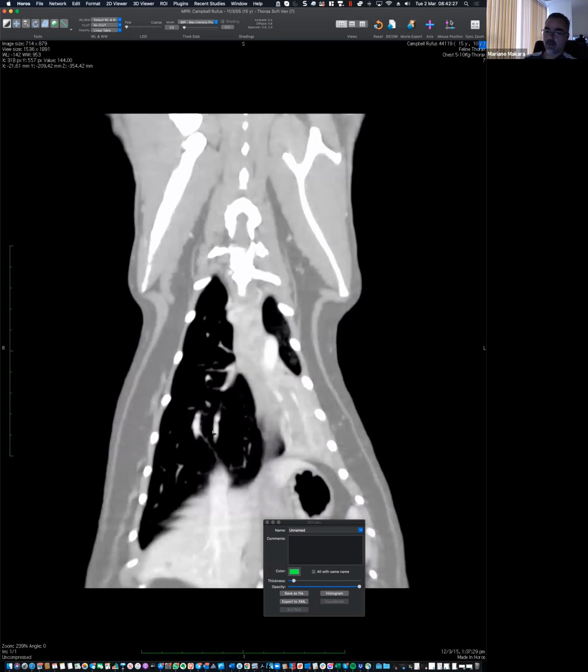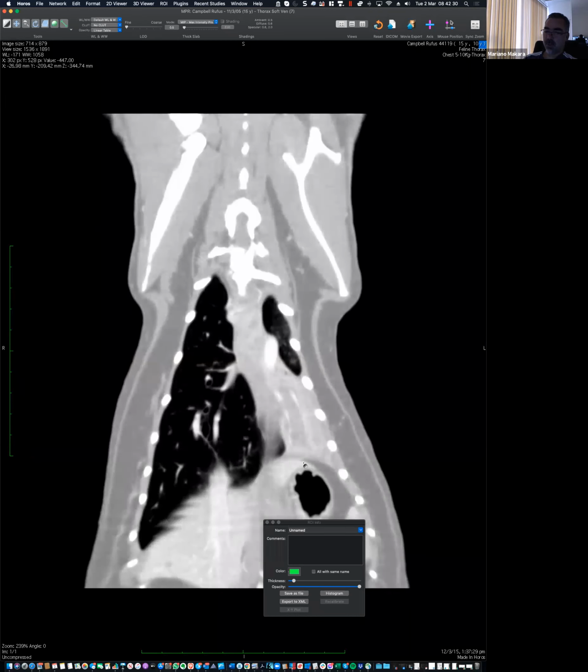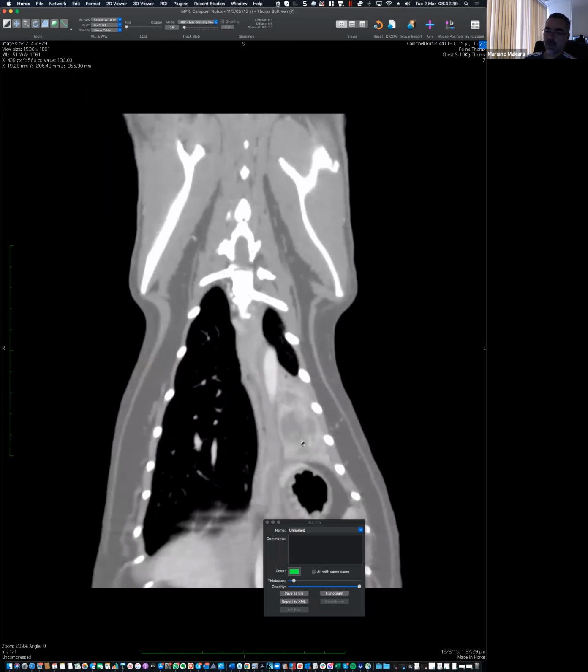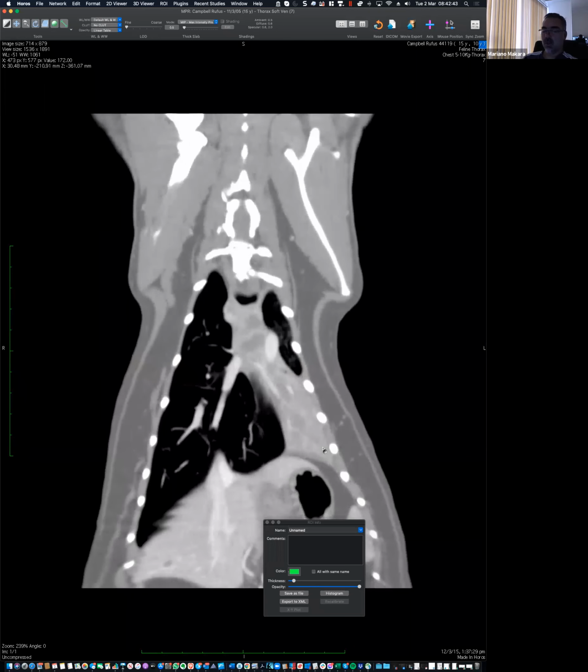That's a normal airway, normal bronchi. In the affected side, the lung is smaller, there is soft tissue opacity, and there is soft tissue material within the airway. Okay, and this is probably part of the mass. So the mass really grows here, it walks through the airway, and then results in a mass there. Makes sense? So it's really a neoplasia that extends through the airway.